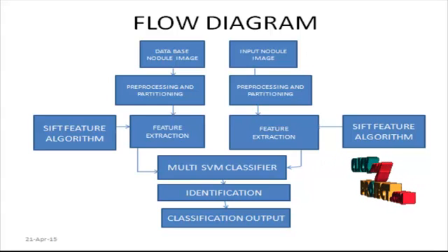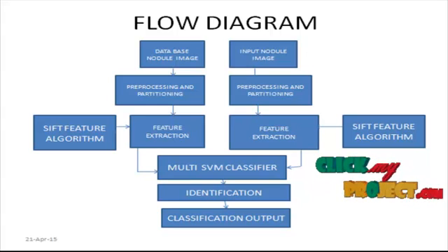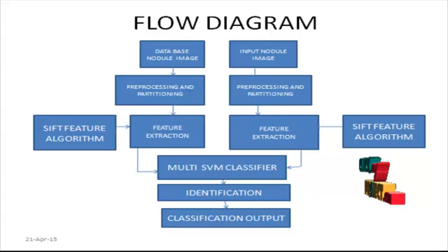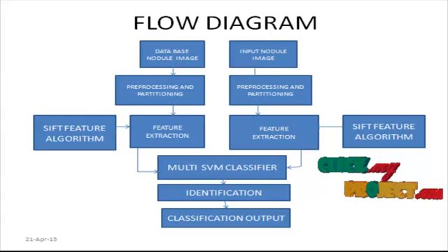retrieving the overall information to classify the selected images for the input nodule images. The input nodule image is cropped from the overall lung image and partitioned with the selected images, and the feature extraction base is identified. This feature extraction is based on the edge reduction for the SIFT feature methodology.